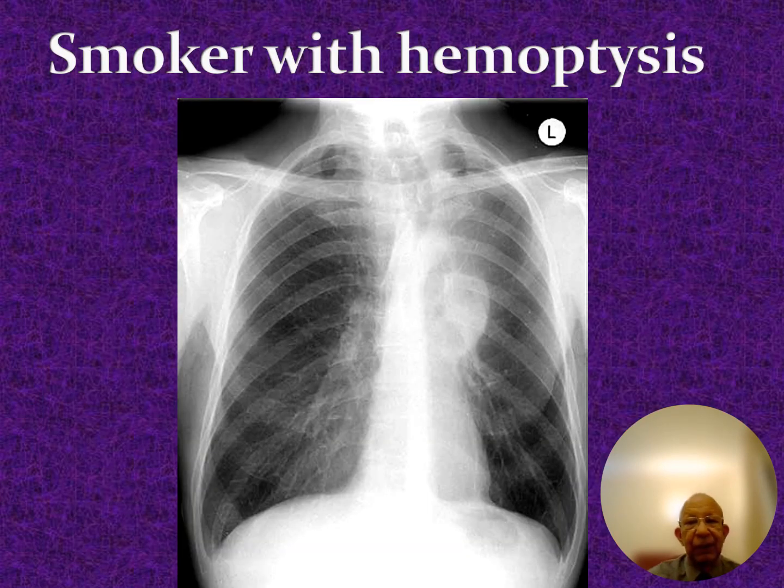Now let's look at this. Now you can see here that the trachea is deviated to the left. Now it's deviated to the left, it is either pushed or pulled. Now it could be pushed by a large pleural effusion or a tension pneumothorax, or it could be pulled because of a collapsed lung, okay, on the left side, or collapsed lobe on the left side. So you can see that with this trachea the rule is broken and it's now shifted to the left side.